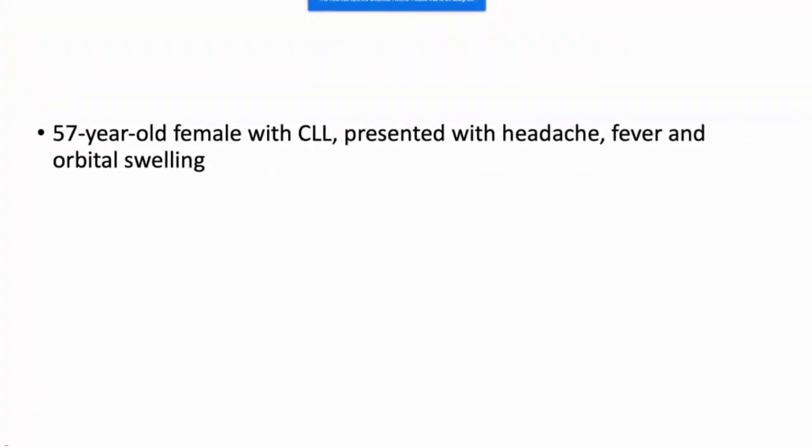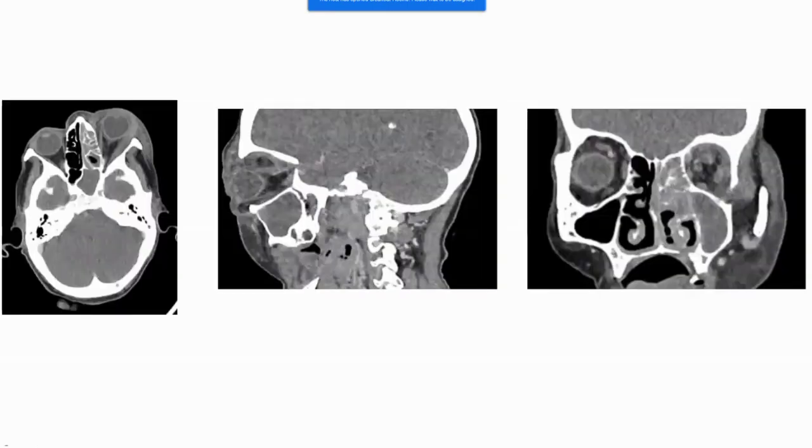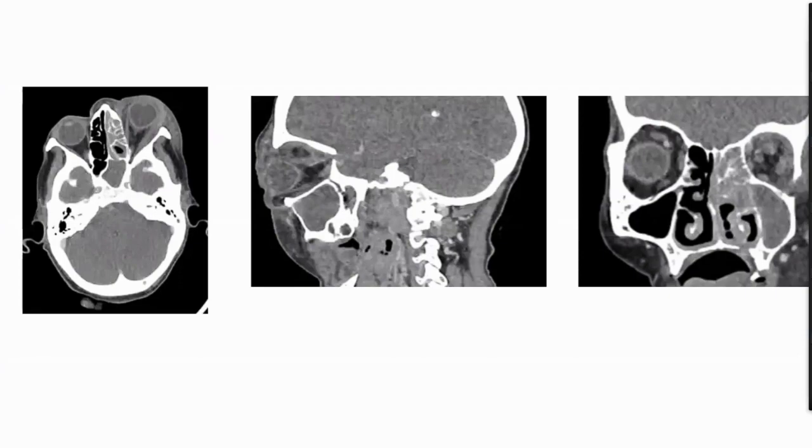It's a 57-year-old female with CLL, presented with headache, fever, and orbital swelling. I've been provided a CT scan, axial view of the orbit, and the sagittal and coronal images.